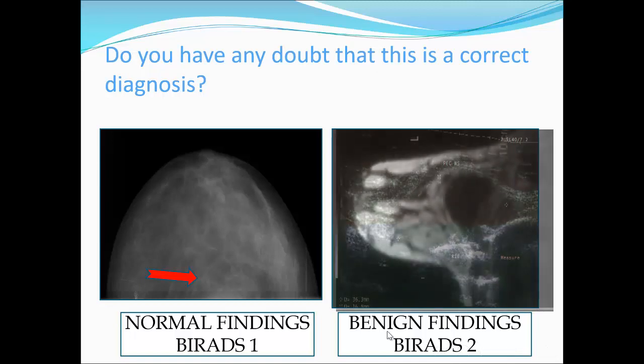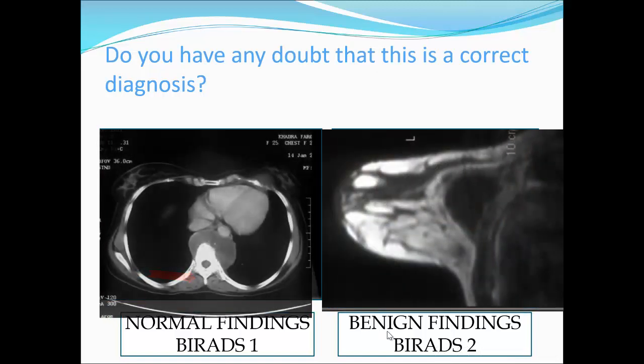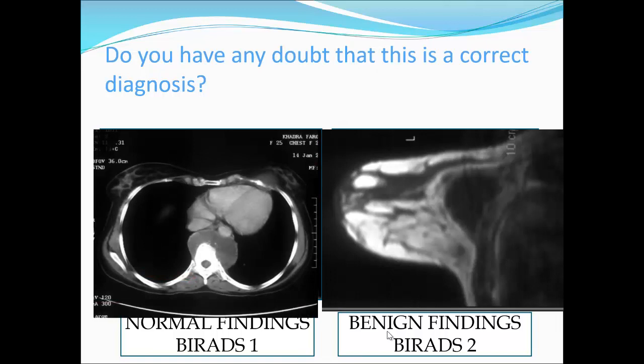And of course, we do MRI, find that this abscess is coming from the rib, and unfortunately the patient has many others. This is the mass in the breast, but she has also spinal cold abscess, but she didn't know that this mass is a part of this pathology. So always think of systemic diseases that may affect the breast.